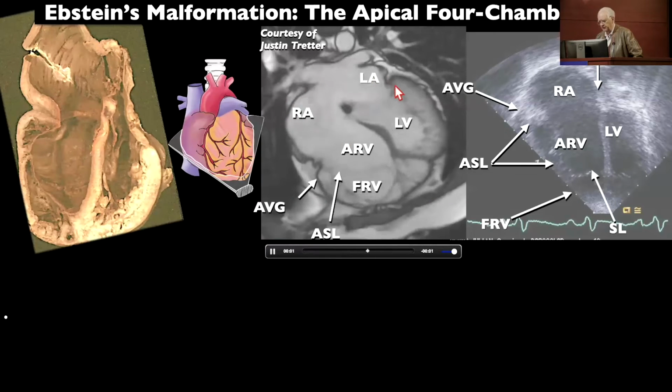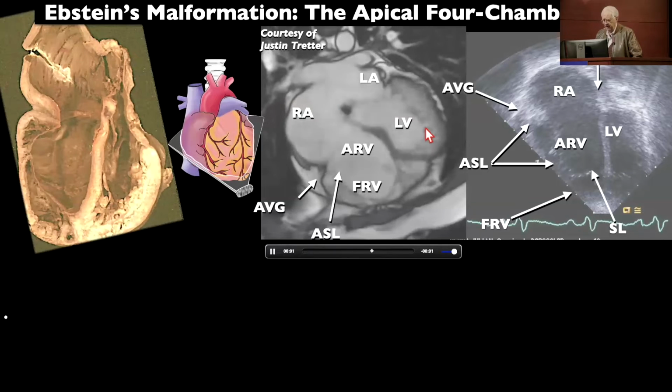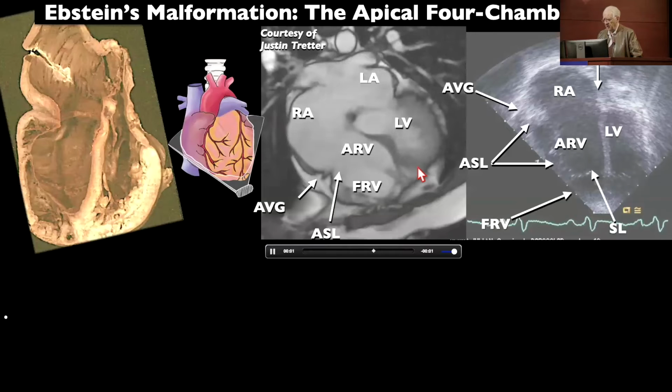What you haven't looked at, which I'm going to interpret for you, is that there's also spongy myocardium of this patient. So this isn't just Ebstein's, but a number of them have also spongy myocardium or non-compaction of the left ventricle. And I think that puts us in the idea that what Ebstein's may eventually be is a form of a cardiomyopathy.